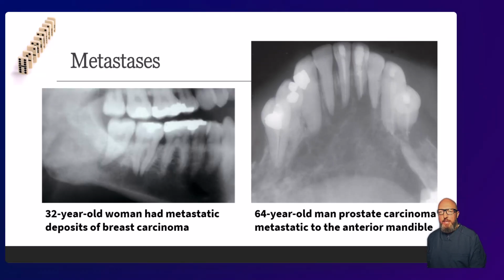All right, I have mentioned metastases, so let's go real quick here. Notice how in some cases this can be really deceptive. Metastases, same with leukemia, although probably younger patient. This just looks like a periapical lesion. They have a sizable occlusal restoration. No reason to think that's not a periapical lesion, but if you vitality test this tooth and it tests vital, be wary, maybe compare with the patient history.